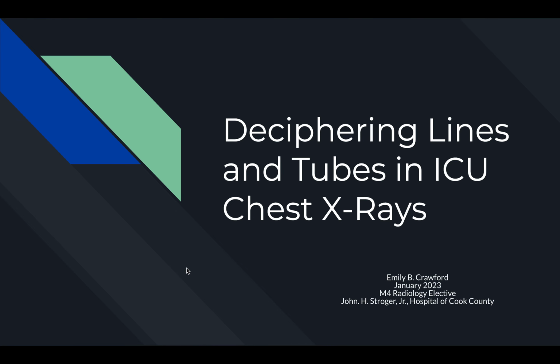My name is Emily Crawford, and I am a fourth-year student currently completing my radiology elective at Stroger Cook County Hospital. Today, I am going to talk about deciphering lines and tubes in ICU chest x-rays. I am applying internal medicine, so I am hoping that this will serve as a guide for basic interpretation of chest x-rays while rotating through the ICU.